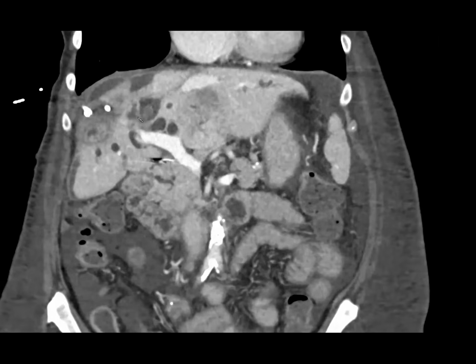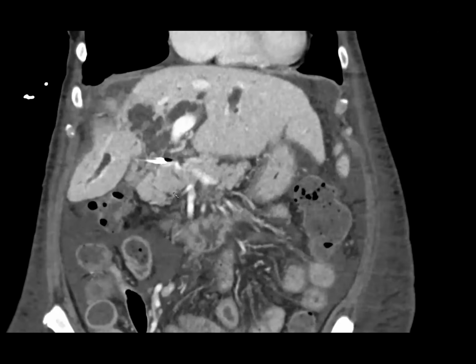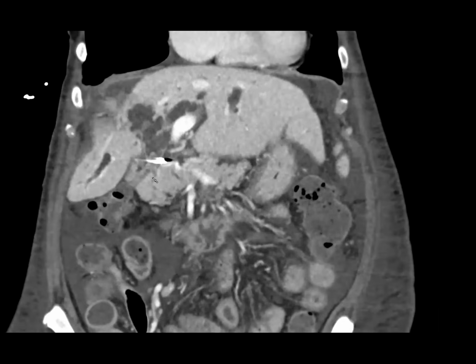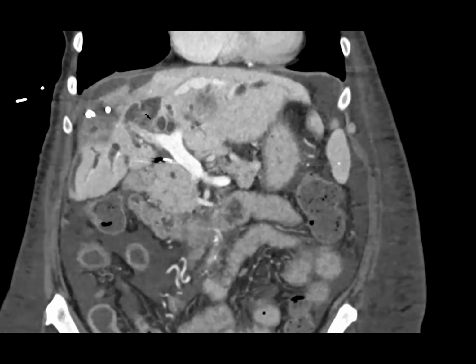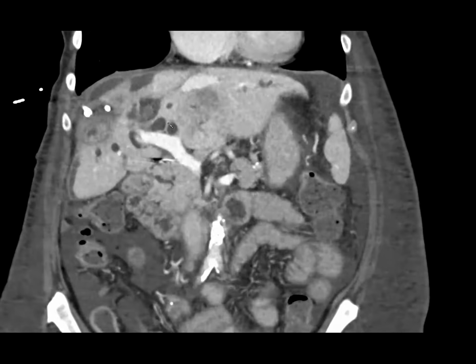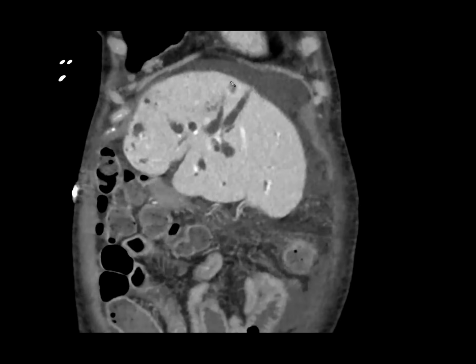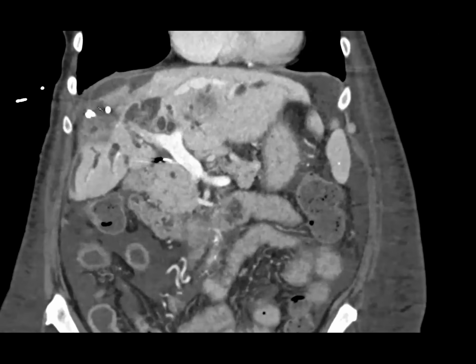And I was really concerned that there was an intraductal cholangio and all of this stuff here. And then they also had basically a stuff at the hilum. But anyway, they ended up going for ERCP, and all of this was just pus and debris. They did extensive biopsies and brushings, and all of this was cholangitis with pus and debris, and that was what was causing these little micro abscesses in the liver, one of which has a drain in it.